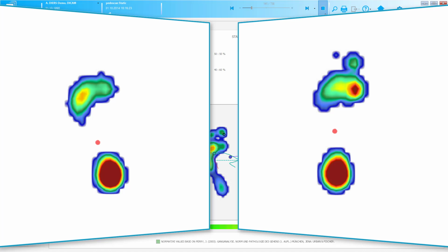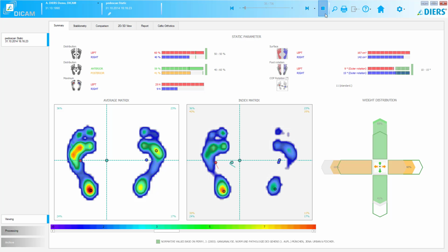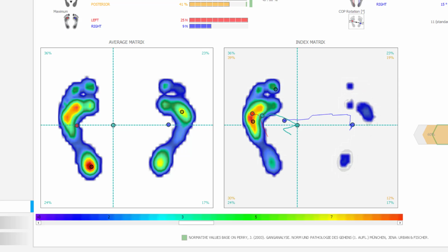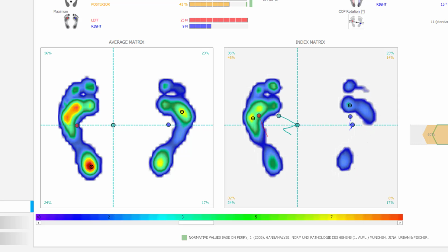In some cases, the concrete pressure distribution in the forefoot or the black dot of the respective pressure maximum displayed per foot can help with differentiation, but in many cases, the difference only becomes visible in a dynamic measurement. Analogous to the COP calculation of the individual feet, the total center of pressure can also be calculated using the pressure values recorded on both sides. This is then based on the total weight distribution and shows the force distributions displayed in the diagram relatively clearly.